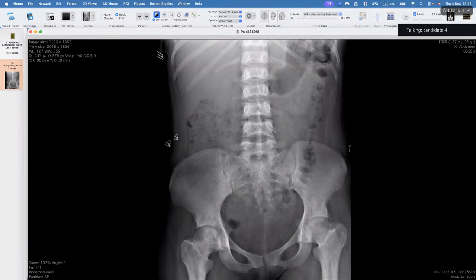So I would like to know if there is a diffusely increased bone density of the vertebral body and the ribs, or if that is just projectional for the ribs. Because for the pelvis, the density appears to be normal, except the femoral head I've described. The bowel pattern that I can see is non-specific and normal.